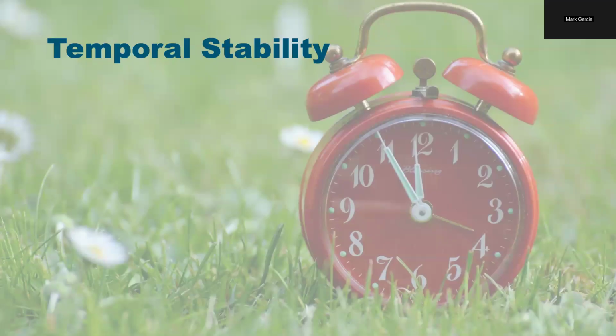What I mean by that is that the ST elevation and the J point notching is actually more prominent at slower heart rates. And it's less obvious when the patient is a bit more tachycardic. So you'll see benign early repolarization more at slower heart rates, and you'll see it less when they're more tachycardic.